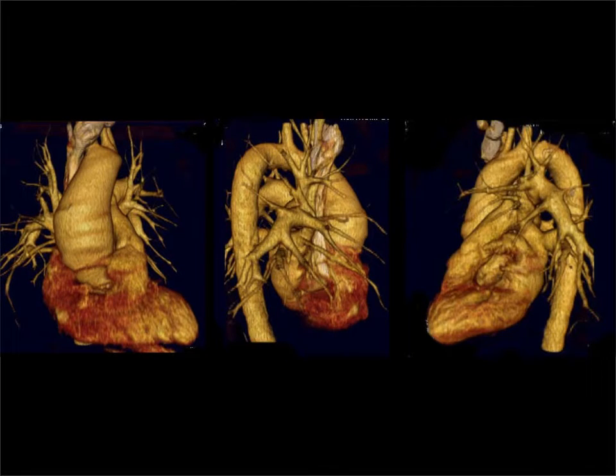I love these 3D CT angiogram maximum intensity projections for showing you these things. So this is a patient who's had a CT with their heart full of contrast, and the computer stripped away everything but the contrast. So here we're looking from anterior, here we're looking from the patient's right, and here we're looking from the patient's left. So here is the ascending aorta coming out, and this is abnormal. This is wide, and this patient has an ascending aortic aneurysm here.